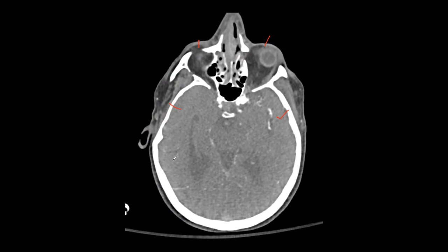In the boards, when they give you a CT image or an MR image, they are focusing on the abnormality very well, right? And once you pick it's an arterial study, then definitely focus on your arteries or your veins to come up with the diagnosis for your exam. So what is this structure?